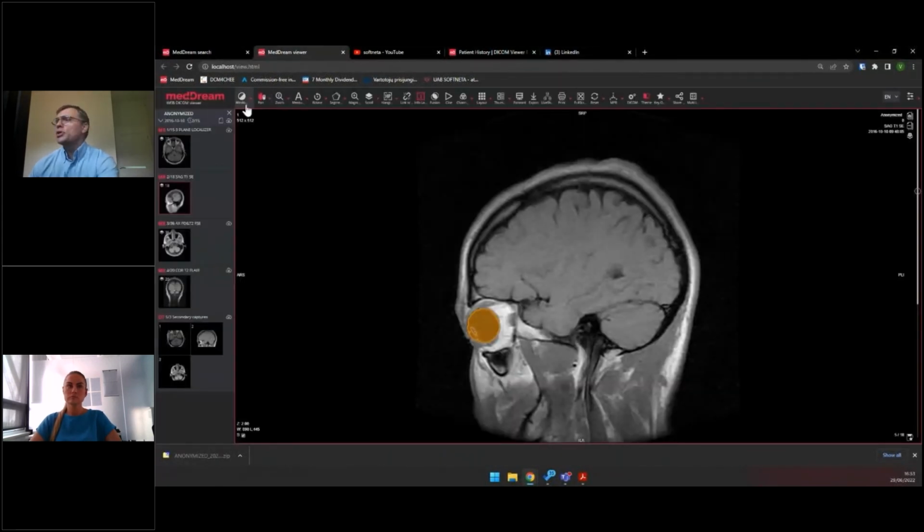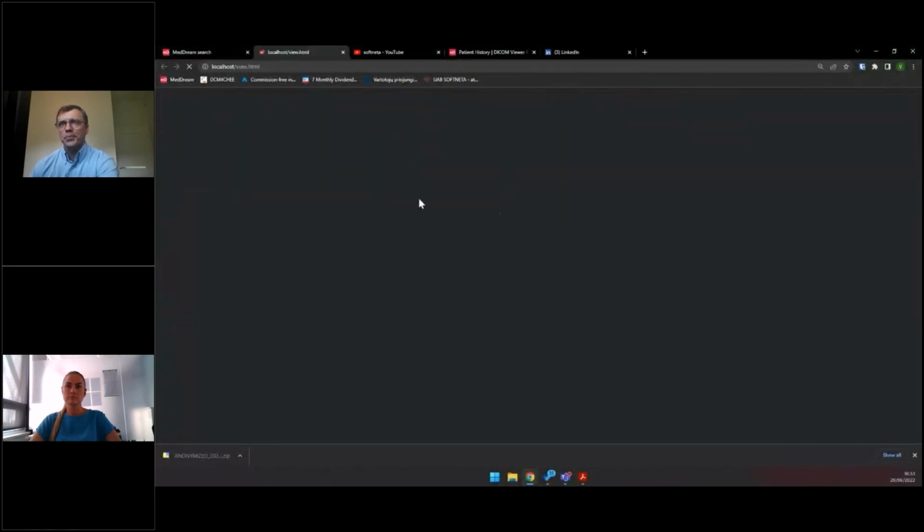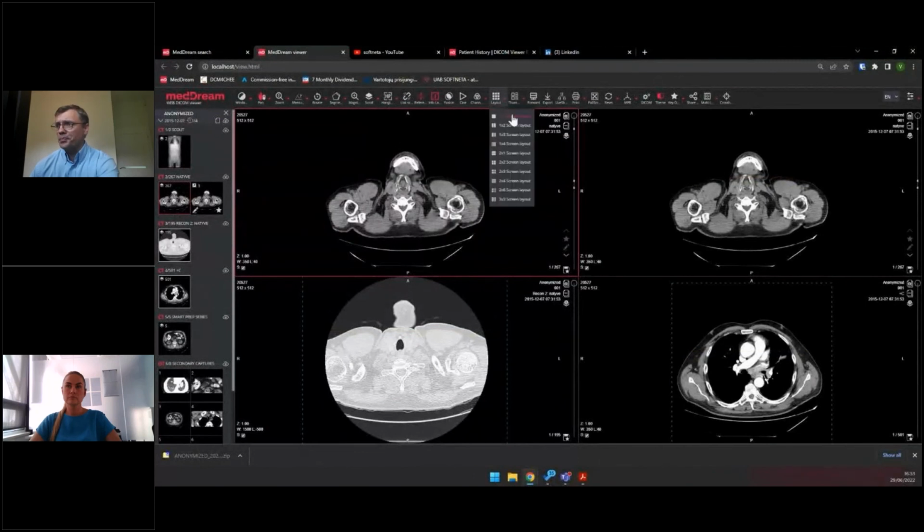Now I'm switching into MedDream. Let's check a study which I know has a lot of comments. This is a good example.